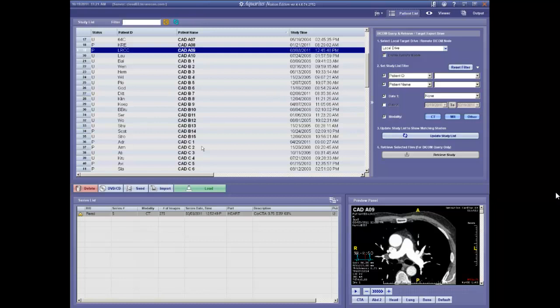But when we can see that much, and we also know that the calcium is creating an exaggeration in its apparent volume just by the nature of CT, this is called a blooming artifact, we just know from experience that that is not going to be an obstructive lesion. Now that patient may have had a calcium score exceeding 100. In fact, he probably did.